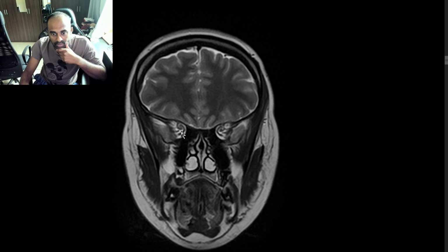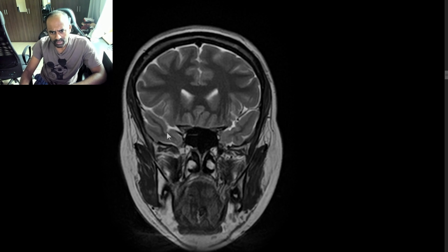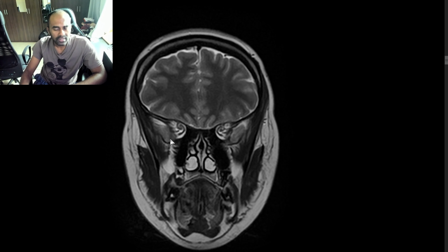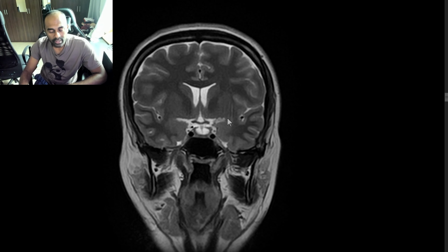If there is any bit of prominence or tortuosity of the optic nerves or a prominence of the perioptic CSF space, you should raise the possibility of idiopathic intracranial hypertension. So a partial empty sella in a young patient who presents with headache without any other imaging finding is probably one of the clues of idiopathic intracranial hypertension. So always look for what is the clinical presentation of the patient, and of course documenting any sort of raised intracranial pressure would require a lumbar puncture.